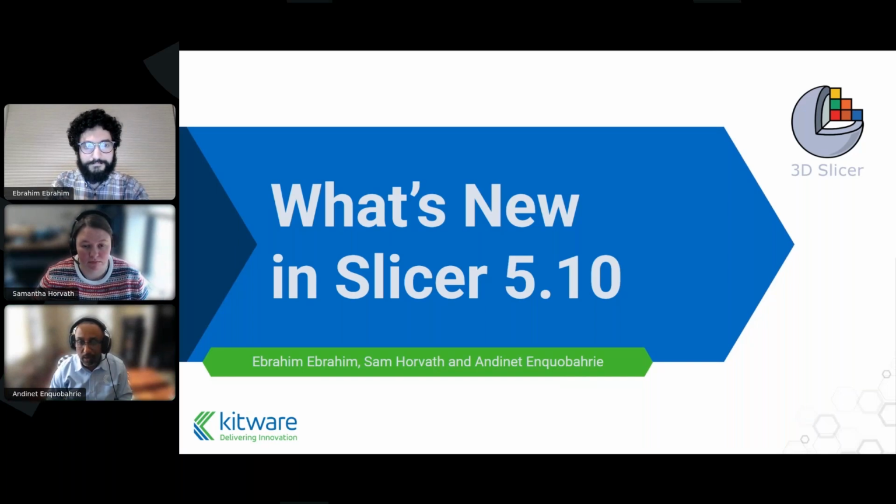Over the next hour, we'll walk you through what's new in version 5.10, which includes upgrades to Python and core dependencies. We've got improvements in volume rendering and segmentation workflows. There are new core modules and also new extensions from the community. We have also scheduled a live demonstration so you can see these features in action.